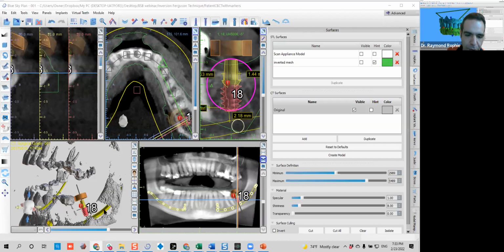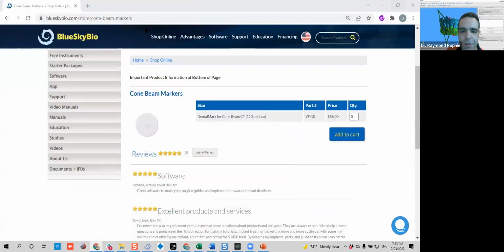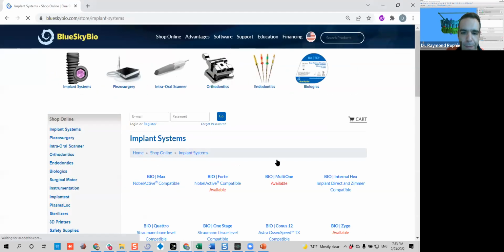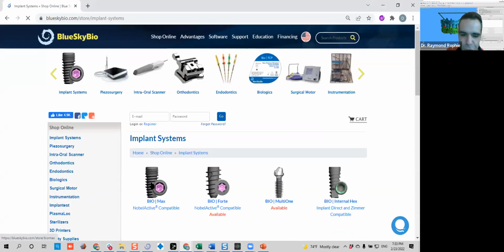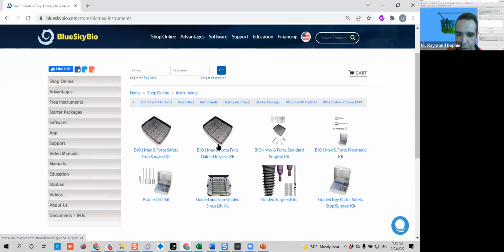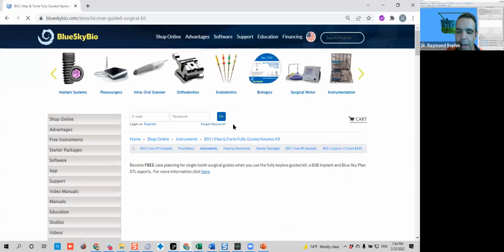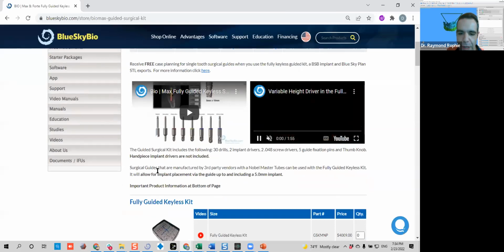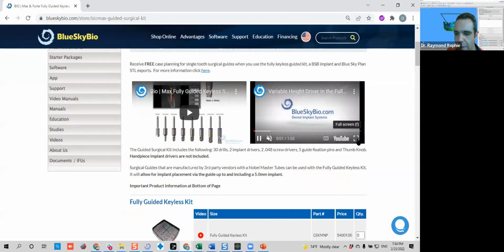In other words, what you're doing at this point in time is you're grabbing your, let me take you right away. Again, this is one of the top 10 questions that I receive every day from the users. So you go to the guided keyless kit. Actually, you can look at these videos. But what I'm doing at this point in time is basically this.